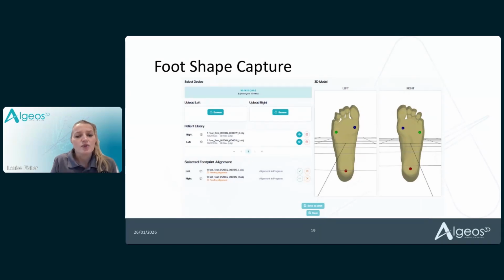And then you have to allocate your little data points onto the first, the fifth, and the heel in order to translate into the design stage. And this is a very important stage of the process, the first stage of the custom process, to allow you to get your product designed and printed.